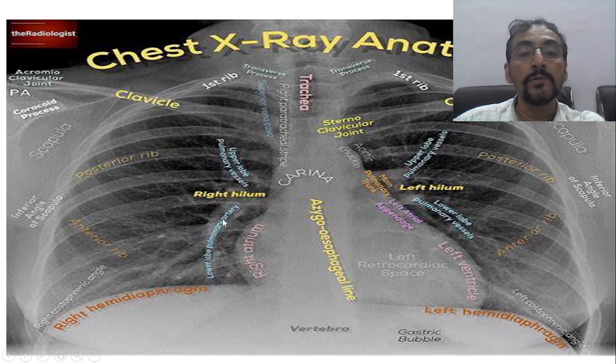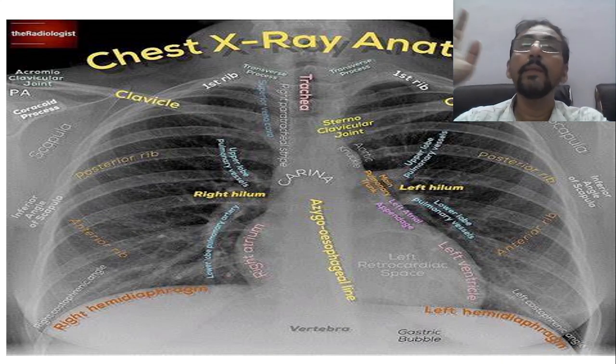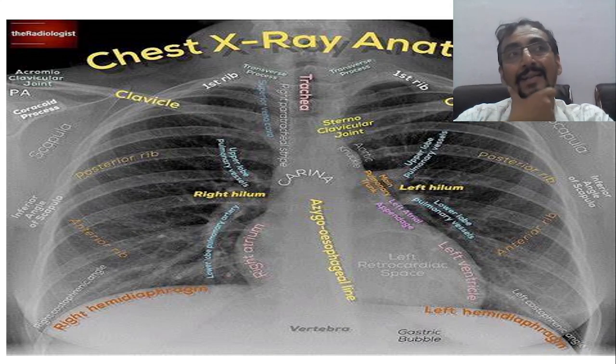Okay, so now this is on the right side. Are you clear? At least the structures on the right side, the medial part, are you clear? Yes, sir. Okay, this is the basic thing.